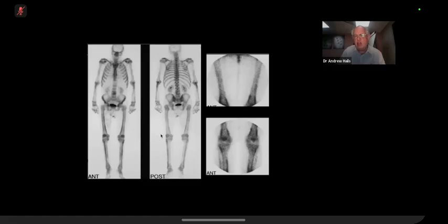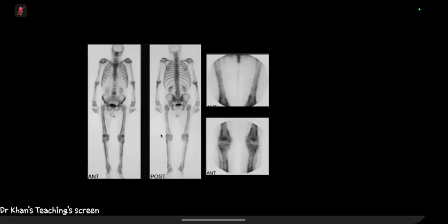So anything else other than venous or arterial insufficiency that might produce this? The thing that I would be concerned about is HPOA. So have they got effusions, and a symmetrical diffuse periosteal reaction secondary to... Yes, that's right.